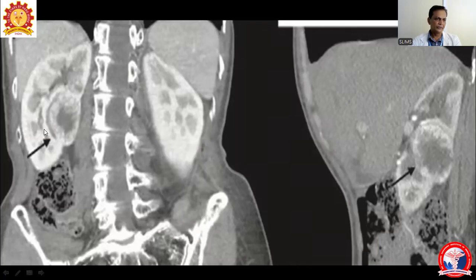Typically, we go to the next image. Here again, a very well-defined renal mass, which is displacing the renal parenchymal internal structures. This lesion is very well defined, centrally non-enhancing, and the pattern is a little bit radiating, where from the central non-enhancing area the radiating pattern is seen towards the outer direction. So this is the central scar, what we call it, in oncocytoma. Another image, same patient.